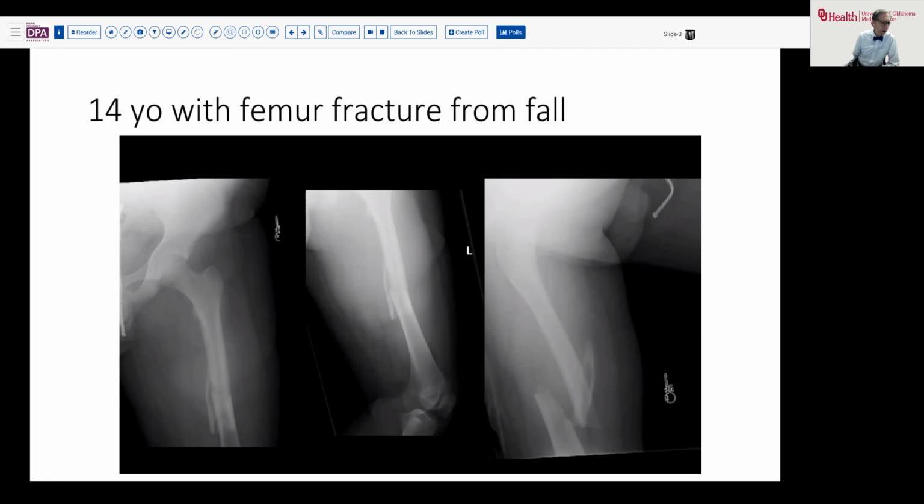So he came to the emergency room with some help, of course, and as you can see from these x-rays, he's got some significant challenges here. He's got a complex fracture that's displaced. You've got several fragments of bone. And looking here through his clothes, of course, you're seeing imperfectly the outlines of a fracture.